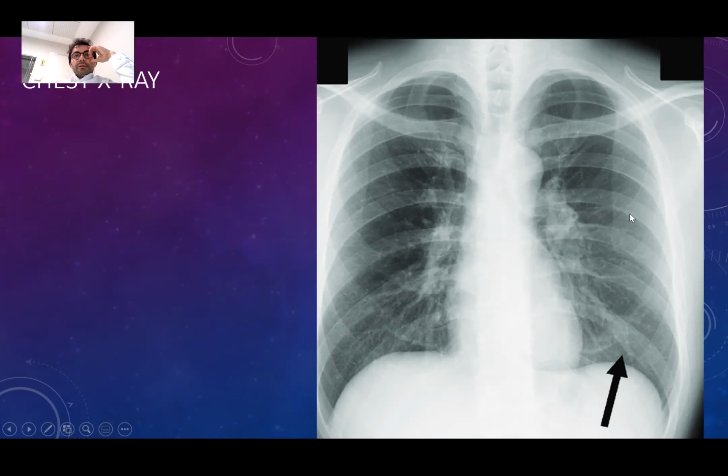I'm seeing that the hila of the lungs are prominent, and some peribronchial cuffing. The bronchi are much more visible than normal. So this patient is having prominent pulmonary vessels plus some bronchitis probably. And the heart is okay, as I said. The vertebrae are okay. Behind the heart and behind the diaphragm, there is no additional infiltration.